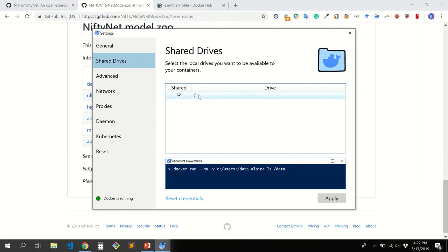Remember that my Docker container, in my case, I am using Linux containers. So I am on the Windows machine, so I have to share in order to show, because if I want to see, for example, an image, I need to install something on my Linux container, but it's more overhead about that container, so I don't want that. So I use my classical image viewer here on Windows using Paint, I don't know, just to see the image, and leave my container in Linux just for the operation.